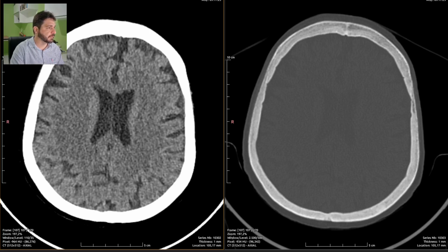Just open this up as much as I can. So, brain CT scan, first of all, just a quick one, and then we're going to go to the chest CT scan. We're going to go to the cervical spine. We're going from the top of the head to the pelvis. That's easier like that.